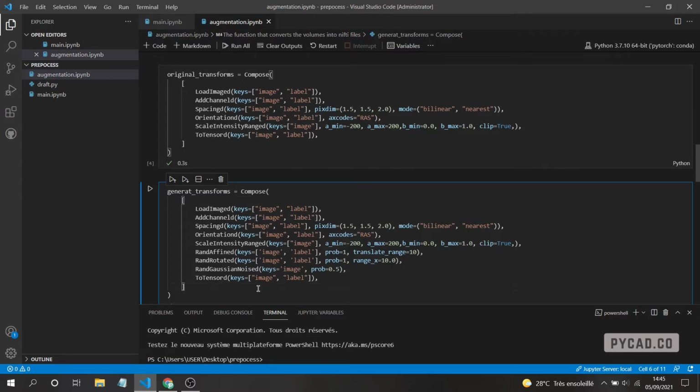The second one is to generate this synthetic data and save it into one of your folders, and add it to your datasets and use it afterwards. So you will get a new amount of data: your 60 patients plus the synthetic patients that you generated. And this second approach worked okay as well for me.